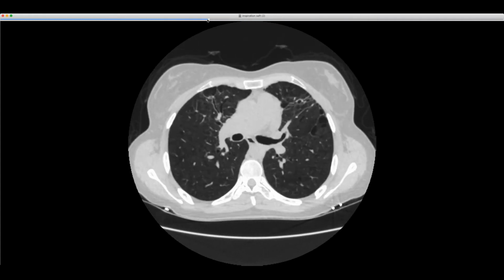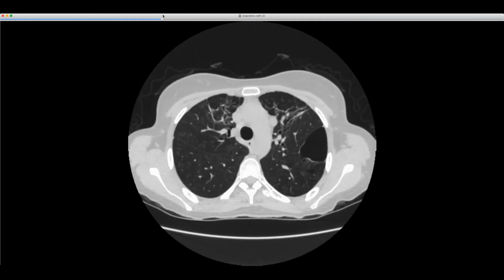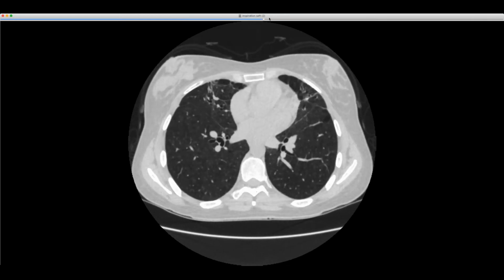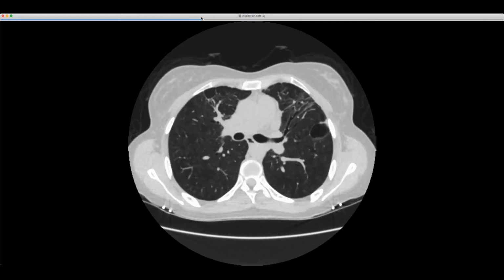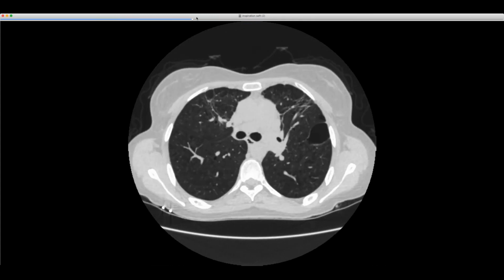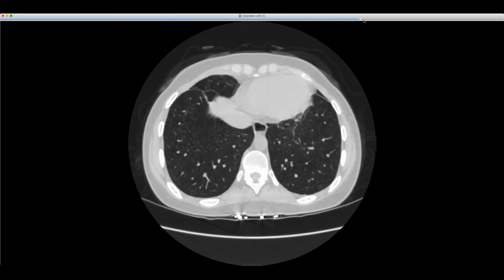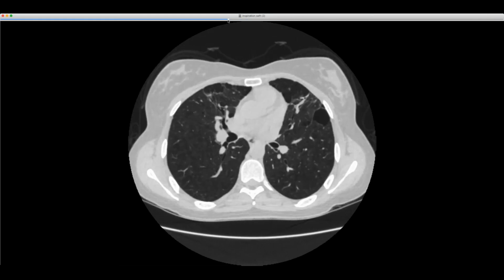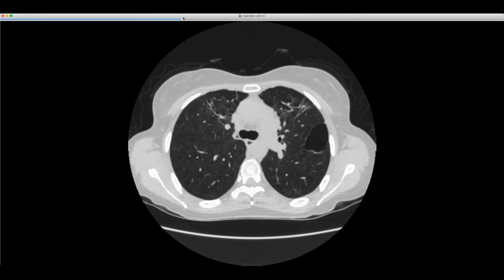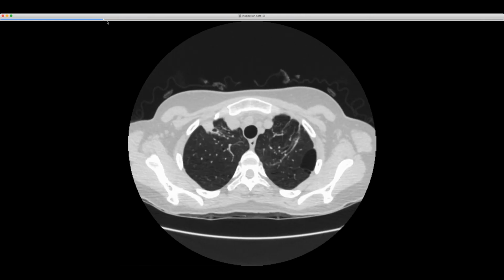David and Brent, two things. One aside is she's got a nice dual congenital anomaly. She's got a tracheobronchus and a left SVC. Yep, right. I'm seeing centrilobular ground glass nodules all throughout the lungs. And she still has centrilobular ground glass within her lungs. So do you think that's organization around the airways or residual bronchiolitis? It could be. I just gave a differential, residual bronchiolitis. Okay. She did not have recurrent pneumonia-like symptoms. Okay. She does have a ton of bronchiolitis.